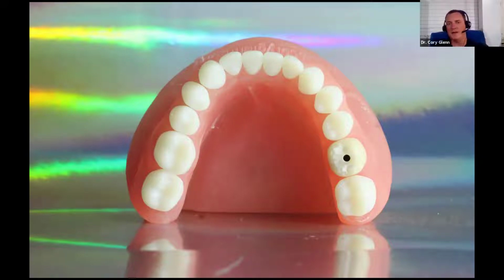Once you've placed the implant, just cut out the little area where that scan body would be protruding, and then fill that area back in with a scan body on the implant. You still flap open all of that, but it'll only pick up the scan body if that's the only area you cut out. Because what you've created with that one little step that just takes a minute or two is the working model, so you could design their final restoration before they even have their second stage uncovery.